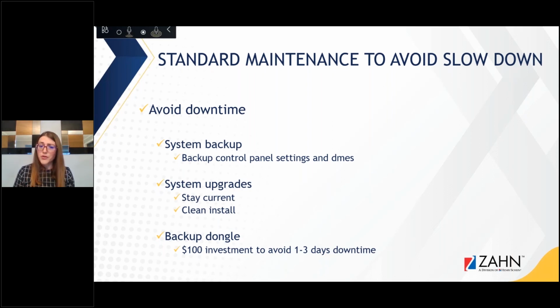So your material libraries, your implant libraries, doctor information is well kept. If you have any custom order setup, anything basically that you were doing before will be there for you to import if you have to do a completely new install. So that helps with getting you back to exactly where you were a little bit faster, right? So save that file somewhere in case of those instances where something might happen that you just lose access to everything.